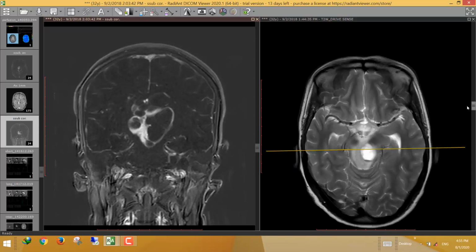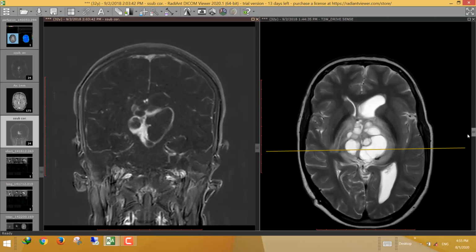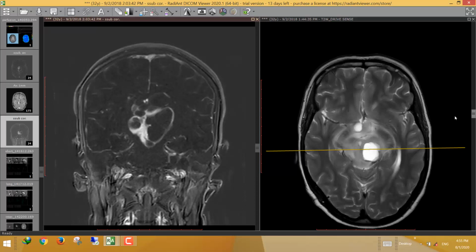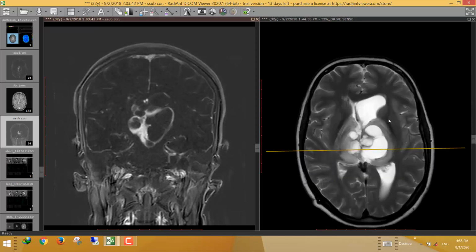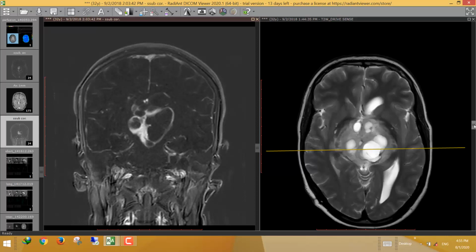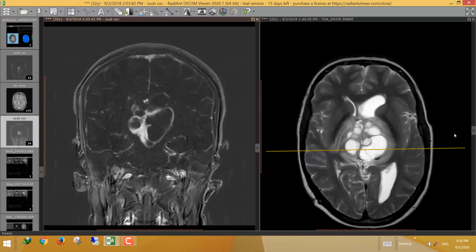It could be compressive edema or possible infiltration from the mass lesion. We can see here also there are supratentorial hydrocephalic changes, evident as dilatation of the left lateral ventricle. The right lateral ventricle here is seen collapsed due to the applied shunt tube, while the left lateral ventricle is seen dilated due to obstruction of its foramen of Monro outlet foramina.